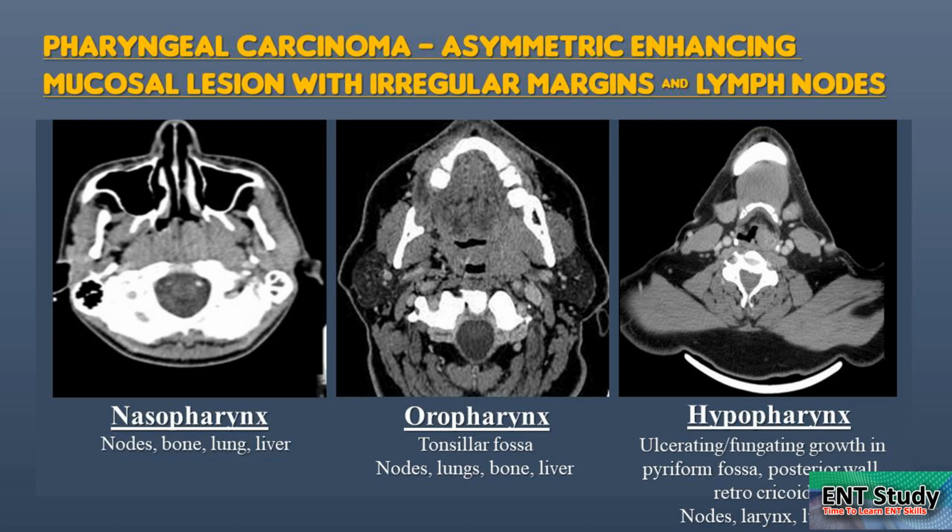As Fahad said, when you are confused about where the lesion is starting and what its origin is, look at the epicenter. And the epicenter is that place where the disease is most manifest. Where do you think the disease is biggest here in this slice? Is it in the laryngopharynx area, or anteriorly, or posteriorly? It is posteriorly, yes, you are right, posteriorly on the left side. So this is a hypopharyngeal lesion which is expanding anteriorly.